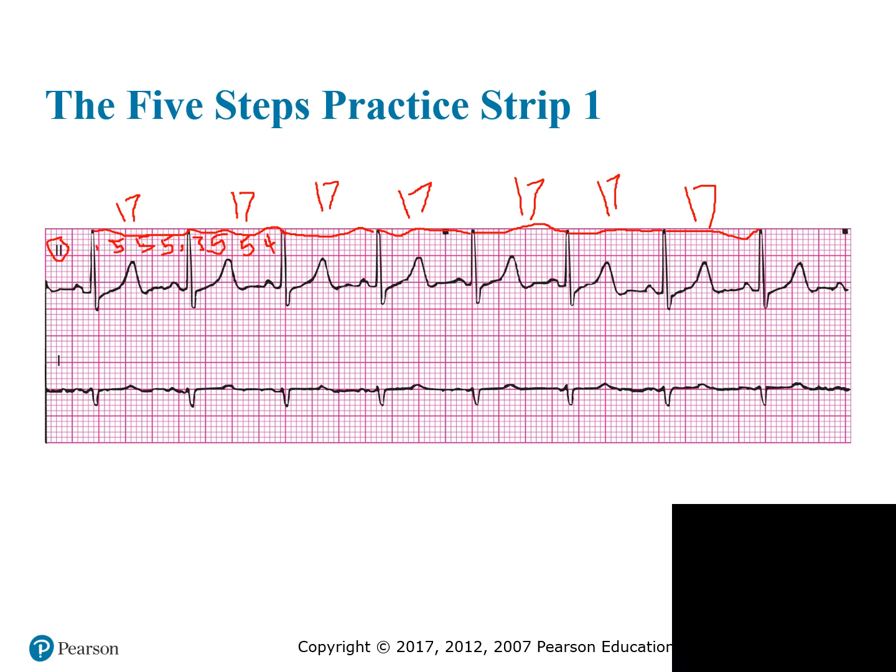So we would say this rhythm is regular, right? So we know we have a regular rhythm. So regularity is regular. So we determine that the rhythm is regular, that its regularity is regular.